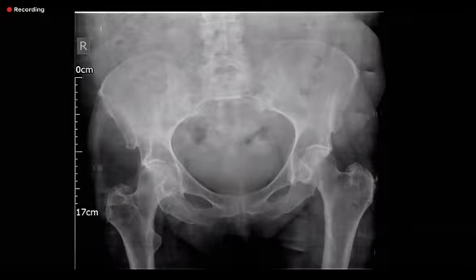Okay. This is a frontal radiograph of this lady's pelvis and the query is of a left neck of femur fracture. Having a quick look through in my usual practice, I also look at orthogonal views as well to aid my assessment. The Shenton's line on the right appears preserved. I think there may be some irregularity on the left side, but I'm not 100% sure. There may be a slight angulation here, which may indicate a fracture.